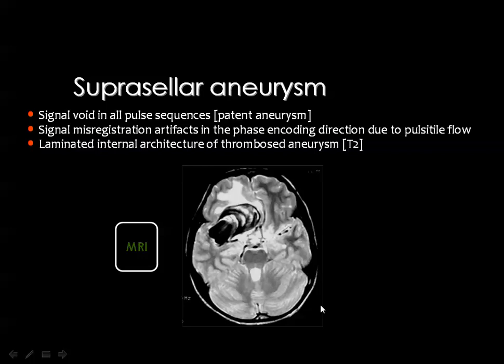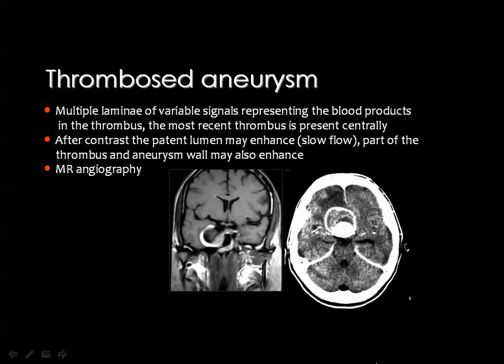Also, remember that one of the most helpful diagnostic criteria for an aneurysm is the presence of whirly artifacts, especially seen in the T2 weighted image, due to turbulence of blood flow whenever it passes through the aneurysm itself. Also, you know that aneurysms may get some internal thrombosis, especially if they are giant.